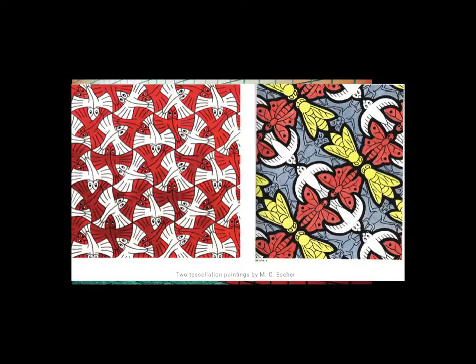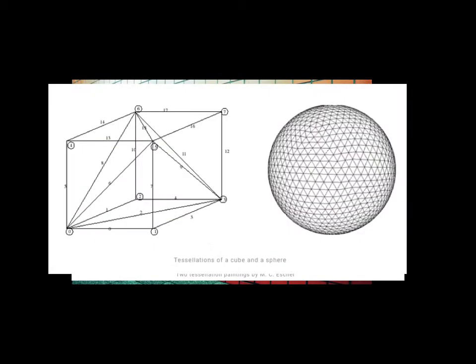It's pretty simple. Now the concept of tessellation is there. If you look at this, this is called a tessellation, where a lot of interconnected triangles or images are there. This is why it is called a standard tessellation language, so that there are no gaps remaining. Printers don't like any gap that remains. So the file format that needs to be exported is called STL.